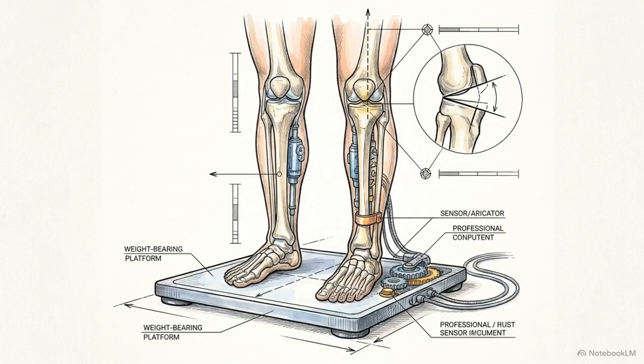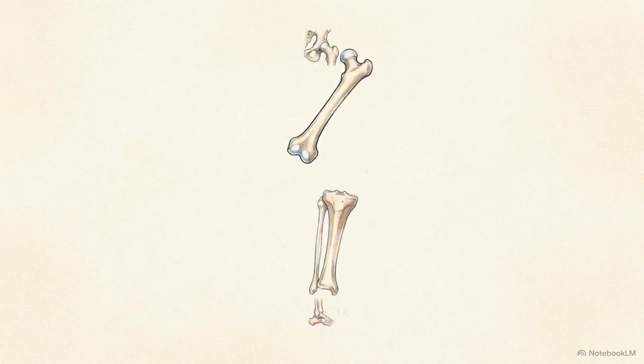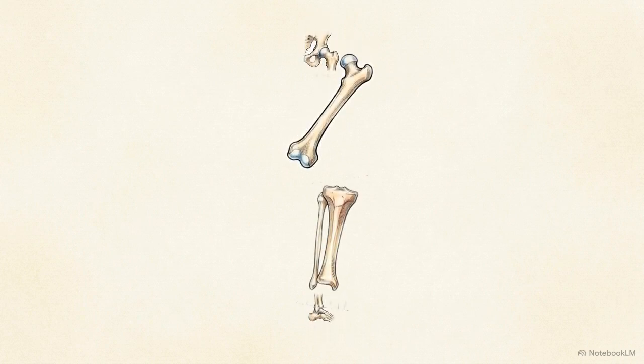The first requirement for precise analysis is a weight-bearing long-axis radiograph. Capturing the leg under active load is the only reliable way to measure true intra-articular wear alongside the bony deformity. The digital planning sequence treats this weight-bearing image as a dynamic coordinate system. It begins with precise size calibration to ensure digital measurements translate to millimeter-accurate physical cuts. Digital nodes at the femoral head, trochanter, condyles, plateau, and talus quantify a 5-degree global hip-knee angle varus.